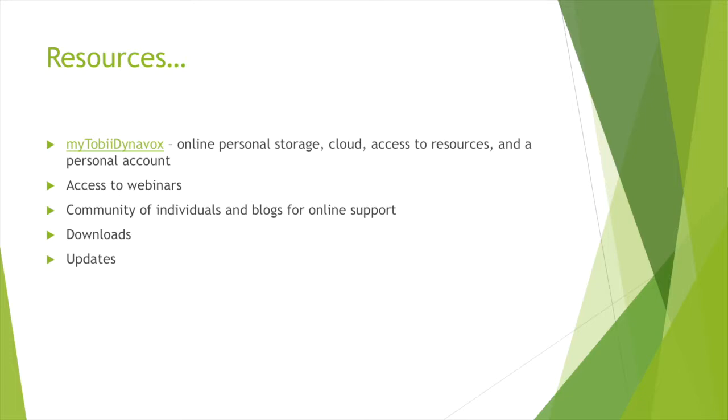The website also gives you access to webinars, a community of individuals and blogs for online support, various downloads and updates the Compass application requires. It has startup videos, a how-to guide, anything and everything you need is located on the device.